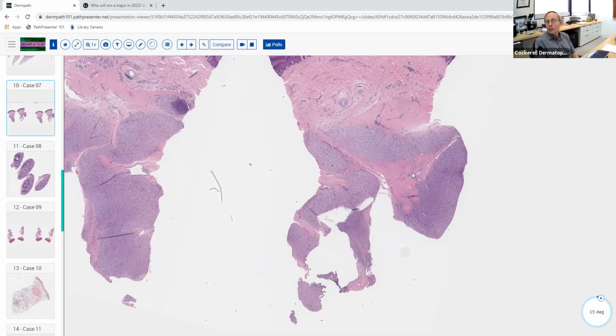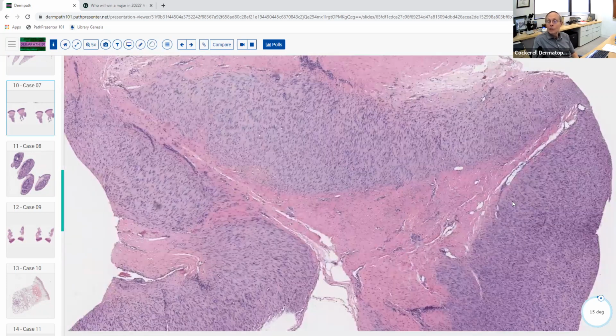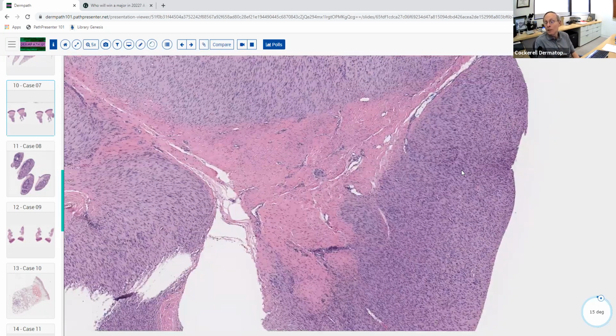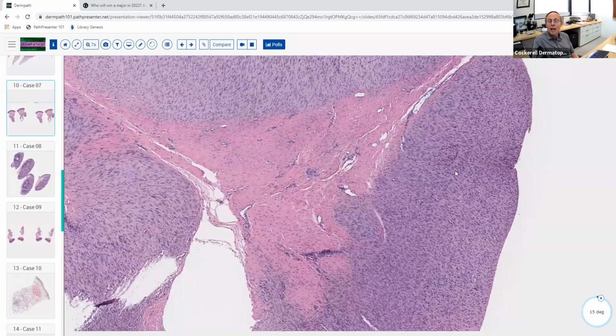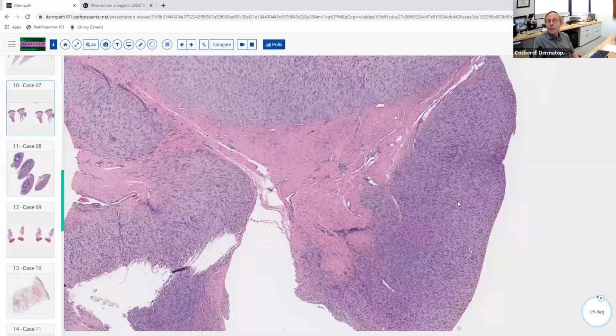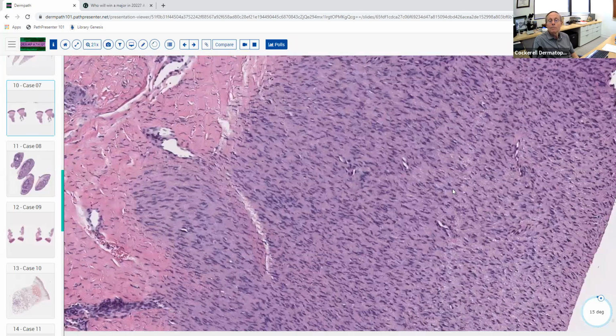It's not comprised of any inflammatory cells, or if they are, they may be forming a neoplasm. We see inflammatory cells like in the mycosis fungoides case we had earlier. That's a neoplasm, but it's comprised of lymphocytes. So here, if there are inflammatory cells, they're forming this multinodular aggregation that may be forming a neoplasm. Now, do you think this is a benign or malignant neoplasm?